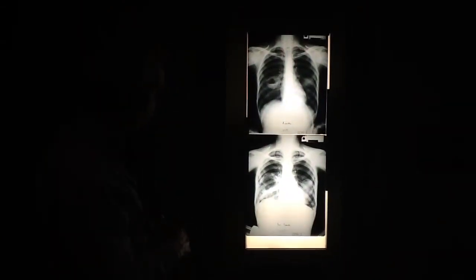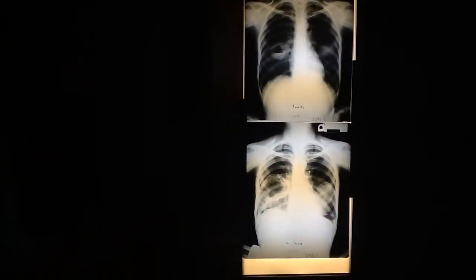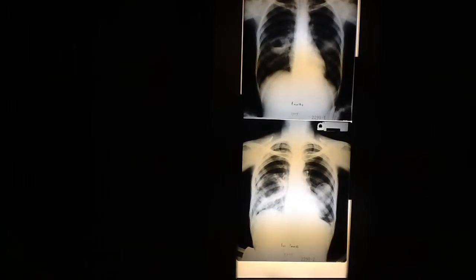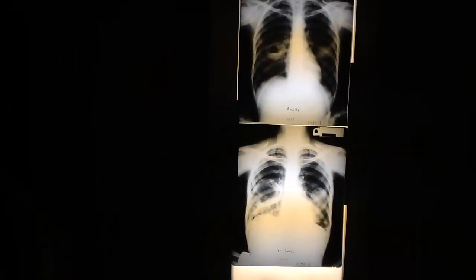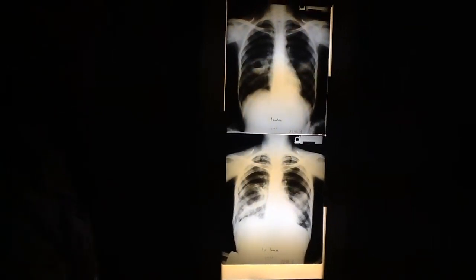This was metastasis. You see this linear density right here? Mm-hmm. That linear density is what's called plate-like atelectasis. It's also called a Fleischner line. Fleischner line. And we'll talk about those in class. They are the result of the diaphragm not moving completely. Okay? Is this a female?